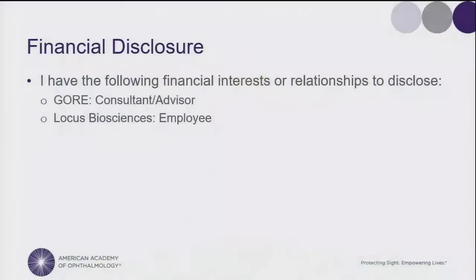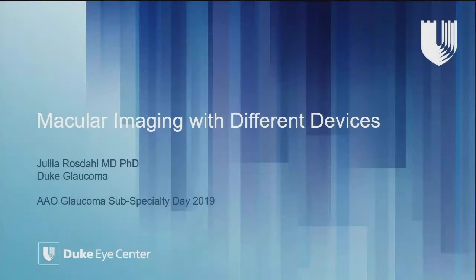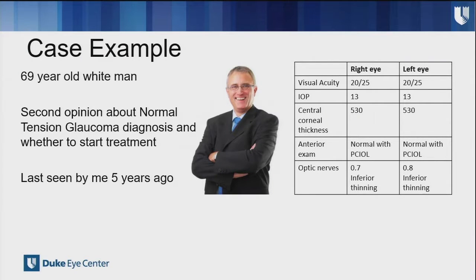Thank you. My financial disclosures are not relevant to this talk, and I would like to thank Dr. Chen and Dr. Ezrani for inviting me to speak with you about macular OCT on different devices for glaucoma. A quick case just to demonstrate how macular OCT helps me to manage glaucoma.